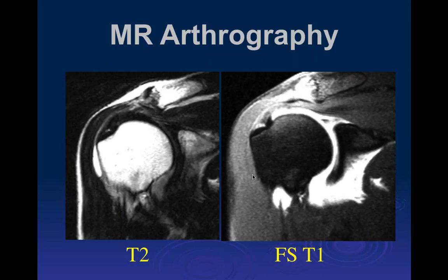So I imagine what we have, and we do have that sort of horizontal linear signal of the distal tendon on the T2. So I imagine what's happening is that's kind of masking a little bit of fluid that tracked around there and covering up a small tear. So what we have here is fluid in the subacromial subdeltoid bursa here, but it's not freely communicating with the joint space. So we don't have contrast in it, and that's why you don't see it on the T1 FatSat.